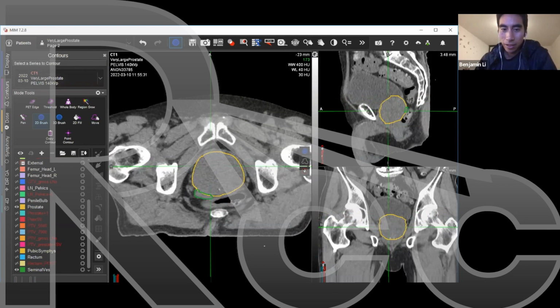So just a really large prostate there. Well, I want to highlight on the sagittal view here, even though this is a giant prostate, you see it still has this pretty round shape. And what we see sometimes more when people are trying to contour the apex, sometimes people fall prey, and when they get to the apex, they keep going and they end up with something that looks more like this. And that is a common error. Really excellent point there, Gun.